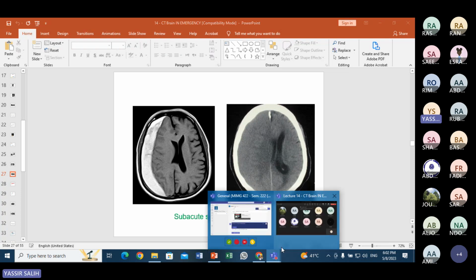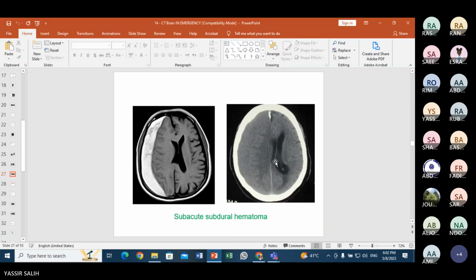How to interpret this CT? Just try to talk. Make a trial, please. Try to comment. Hypodense. Isodense. Isodense, you are right. But please try to report the CT. You are right, this is one of the findings. But what? CT head without contrast. There is a deviation to the left.